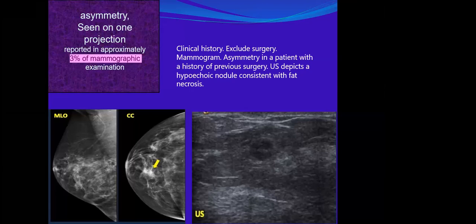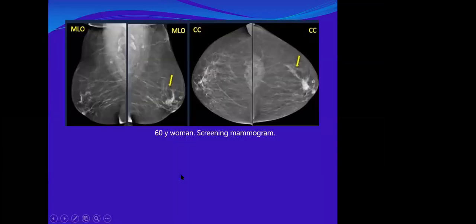And these patients have a clinical history of surgery. So we have to consider what? With a history of surgery, we expect fat necrosis, you see? And it's being proven here on ultrasound. This is mixed, ill-defined mixed echogenicity, or hypoechoic with hyperechogenicity, going with fat necrosis.